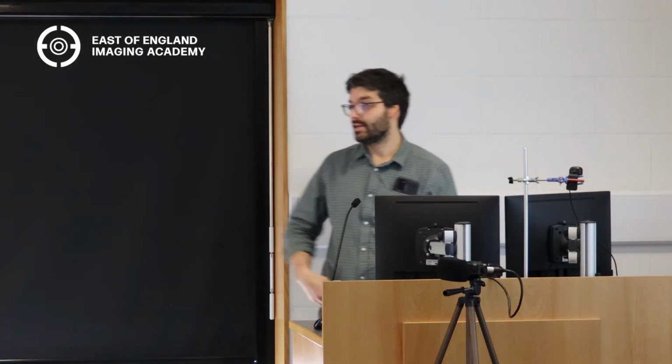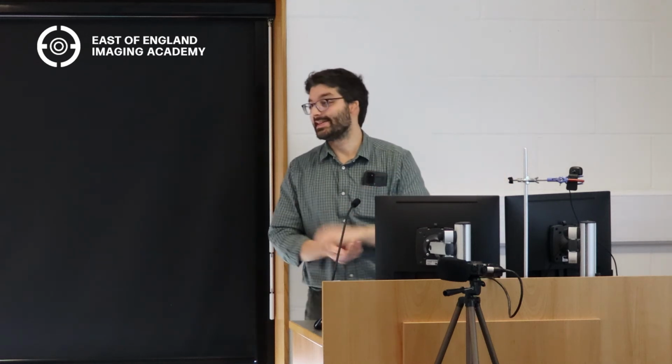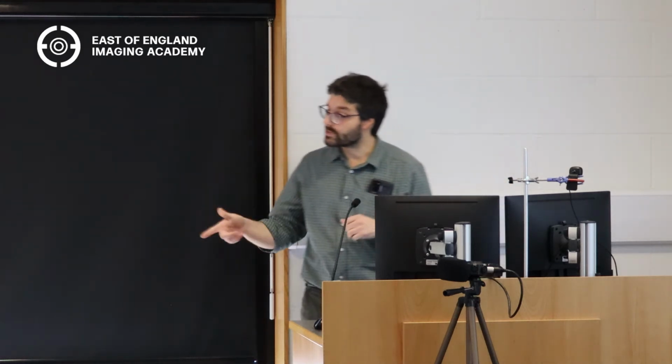The patient actually initially came for an ultrasound for right iliac fossa pain. This was found completely incidentally. They have no symptoms related to this, but you're absolutely right to think about night sweats and things like that, because that makes you think, for example, lymphoma.